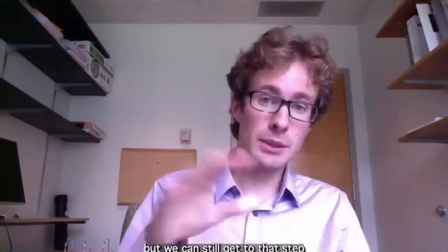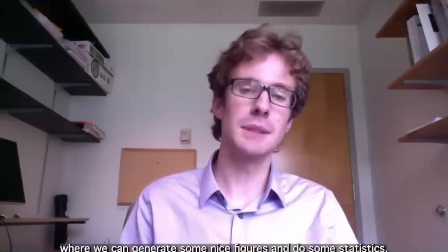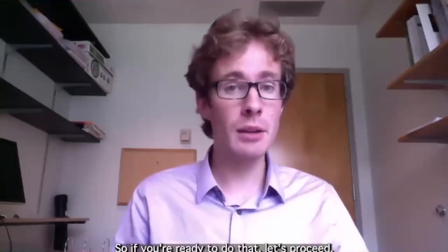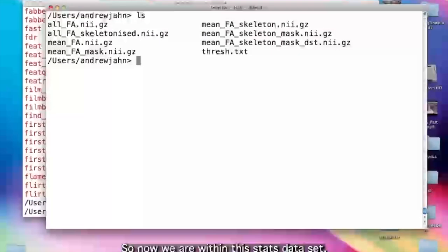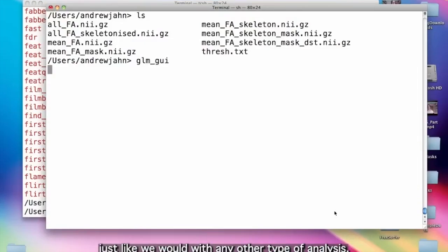But we can still get to that step where we can generate some nice figures and do some statistics. So if you're ready to do that, let's proceed. So now we are within this stats data set, and what we're going to do is set up a GLM just like we would with any other type of analysis.